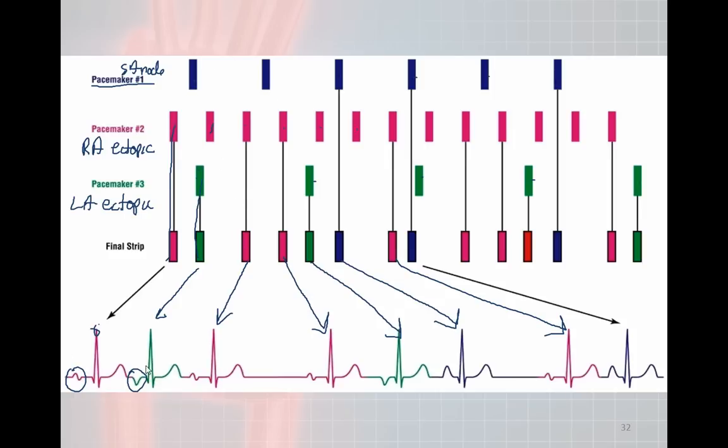the heart. But what we have here is three clear different P wave morphologies. And the easy way to identify this is if you look at this, you can say, okay, there's P wave number 1, and there's a P wave number 1, and there's a P wave number 1. This is a different morphology, so that's P wave number 2, and that's P wave number 2, and that's it for that strip. And then what P waves have we not identified? Here's a third one right here, and there's a 3 right there. Now I have labeled all 3 of my P waves. Okay, so I have 1 morphology, 2 morphologies, and 3 morphologies.